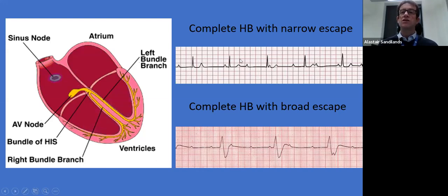So when we look at this example, we have a bradycardia, we have a QRS that's narrow, we have a regular rhythm as the spacing between every QRS is the same. Do we have P waves? Yes, we have P waves. So that means the sinus node is working. What is the relationship of the P waves to the QRS? Well, there is no relationship. It's not 2-to-1 or 1-to-1. You can see the P wave is there. It's buried in the T there. P wave is there. P wave is there. There. Okay, so there's just no relationship at all between these P waves going along.